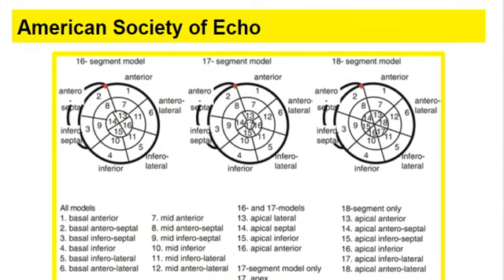A little bit up here, just a little bit. So the 17 segment model is recommended to assess myocardial perfusion when we're performing echoes and even other imaging techniques. The 16 segment model is recommended for routine studies assessing wall motion because truly the activity of the apex and thickening are basically imperceptible. So this shows an apical segment here, but we're not going to actually be able to see the actual tip of the apex.